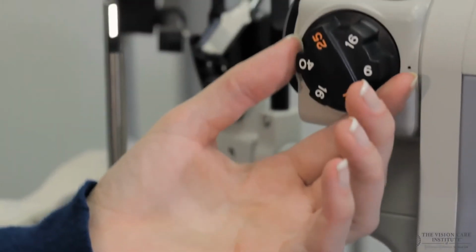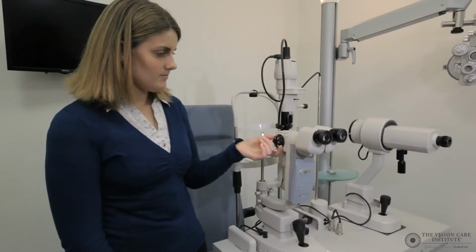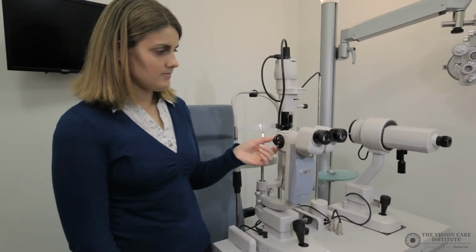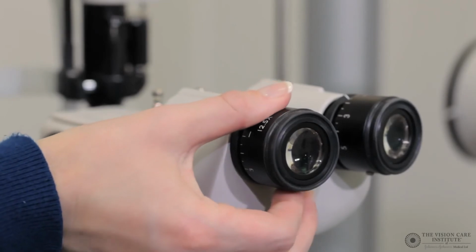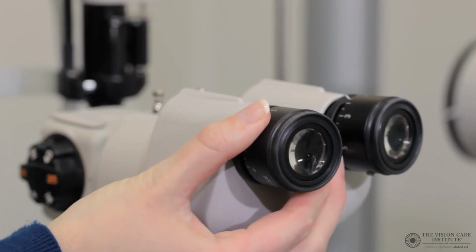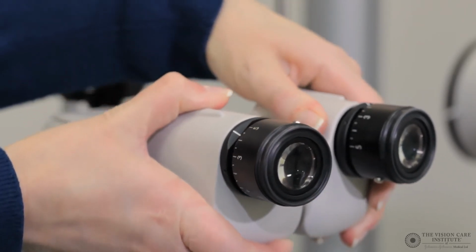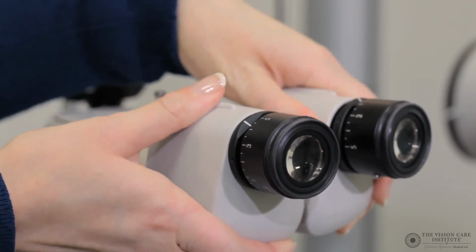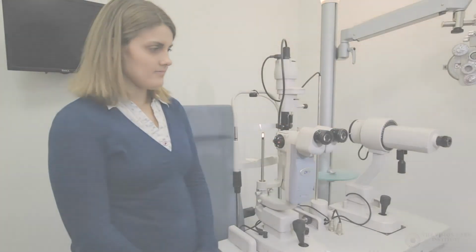The microscope usually has the option of altering magnification, as can be seen here. Before use, the eyepieces of the microscope will need to be adjusted for the individual user. The eyepieces can be adjusted as shown here. When the focusing of each eyepiece is completed, the separation of the eyepieces can be altered to match the separation of the observer's eyes.